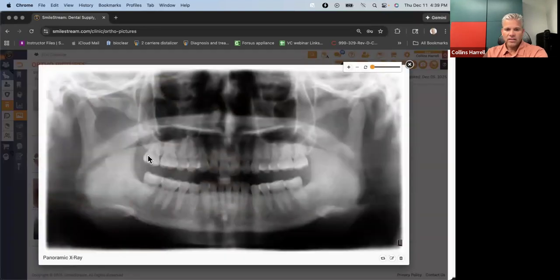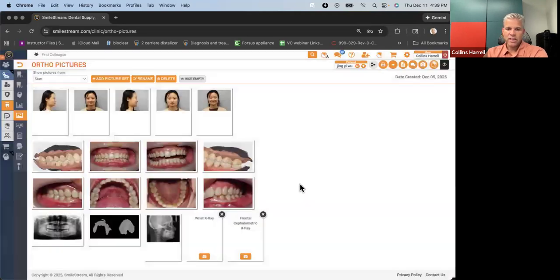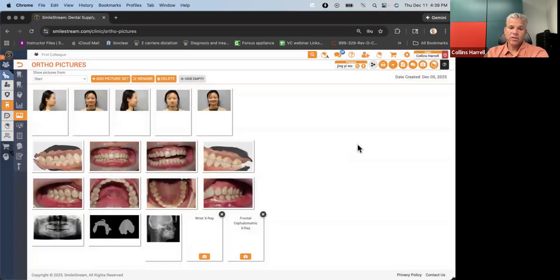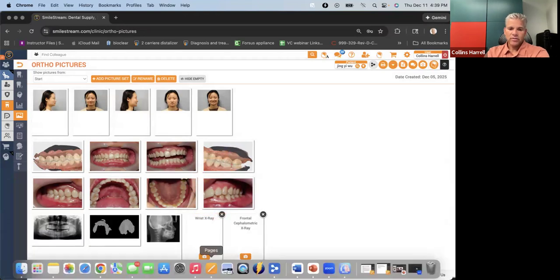We don't have any eights, and she has a kind of average sinus. But with these strong muscles, she's actually one that would distalize fairly easily. And so that might be a consideration for doing aligners, because we'd be able to do some distalization. Well, let's look at what else we've got here.